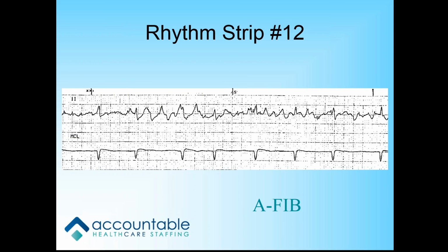And as I've said before, the main thing, this is a person in AFib with a controlled rate, so they're probably going to be just fine. Okay? Okay, Jess, thank you.